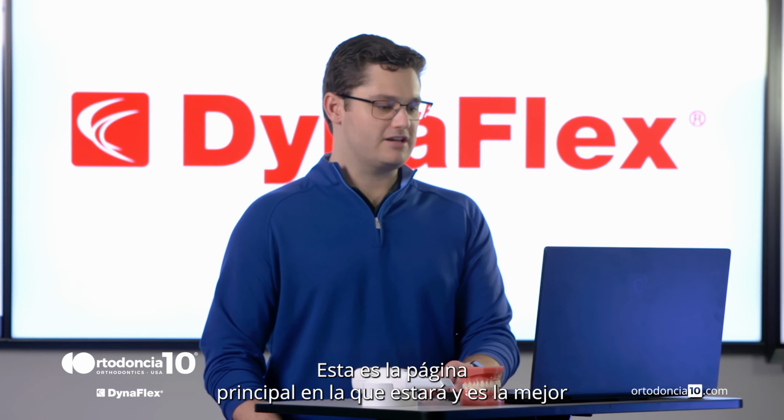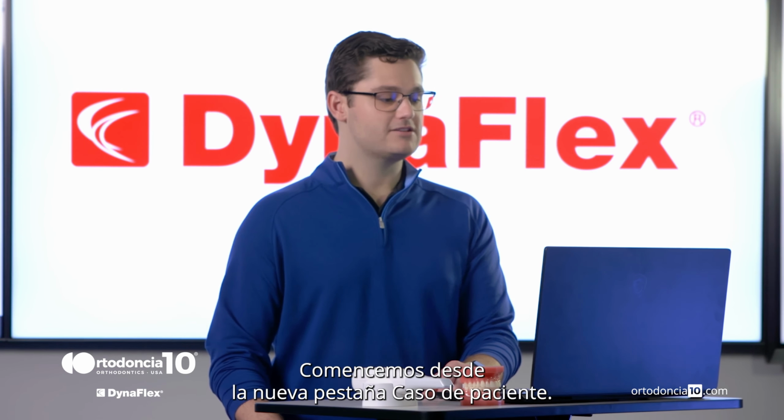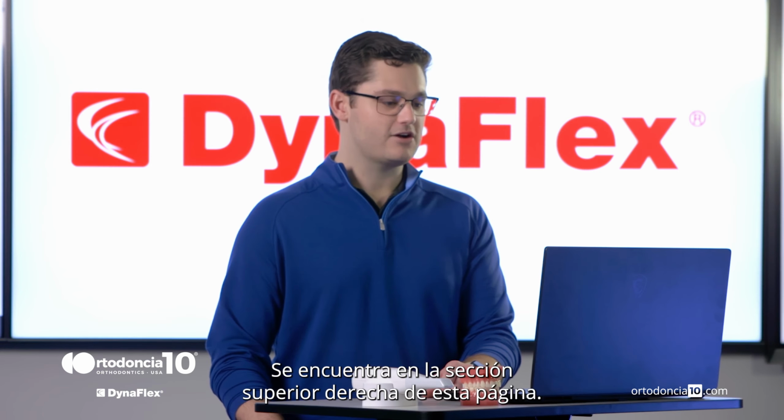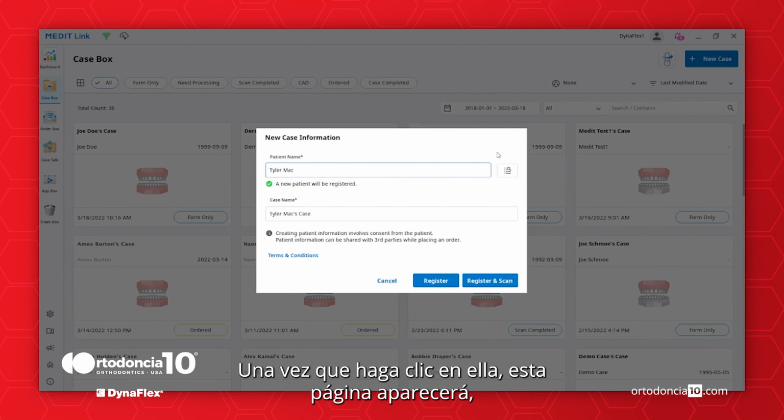This is the main page you will be on and is the best way to monitor patient cases or create a new patient case. Let's start from the New Patient Case tab. It's located in the upper right section of this page. Once you click on it, this page will pop up.